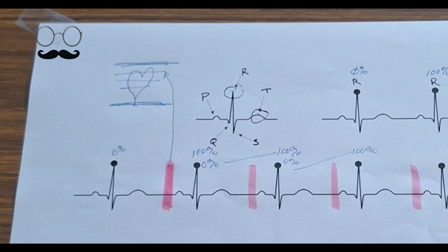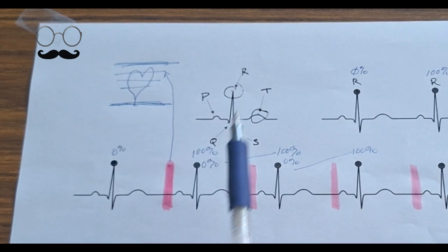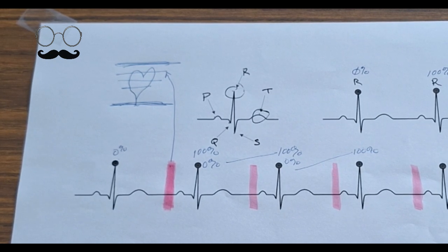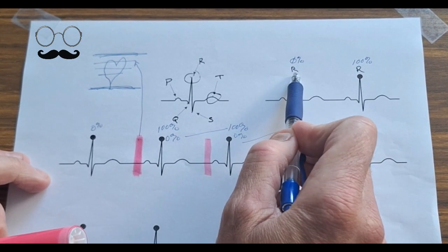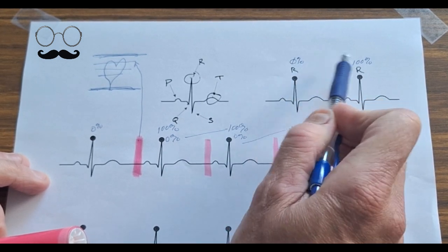Again, if this is prospective scanning, what's happening here is it's guessing. It's looking at beats, looking at beats, looking at beats, it's guessing, and boom, it's going to scan. However, there's also something called retrospective scanning, and we will dive more into that in an upcoming video. What I want you to gather today is that we have the R wave, it must be tagged well, and it is based off of percentage 0 to 100.